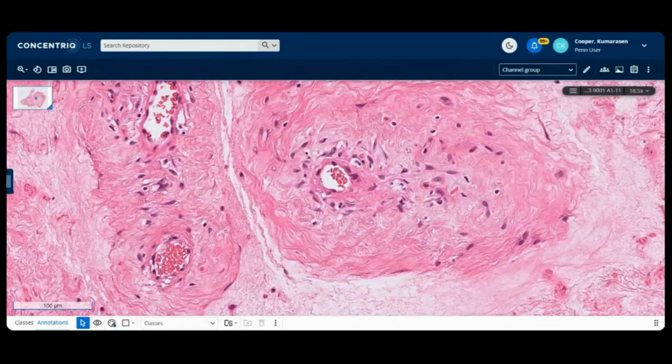In myofibroblastoma, they're usually small, not the hyalinized ones of cellular angiofibroma, but you do get the small capillary type vessels. They're much more cellular. They can be edematous as well, but those of you who look at the breast will know this much better than me. Myofibroblastoma is pretty much a little more uniform, but a whole slew of morphologies can occur in myofibroblastoma.